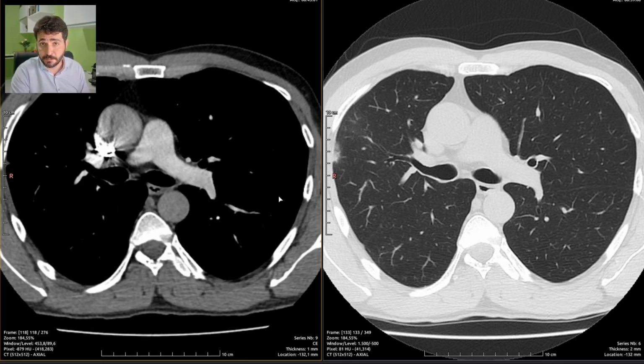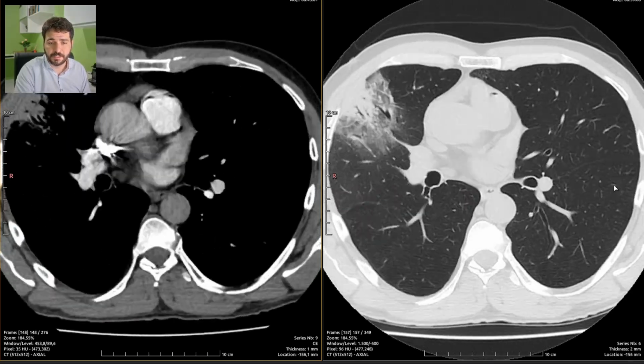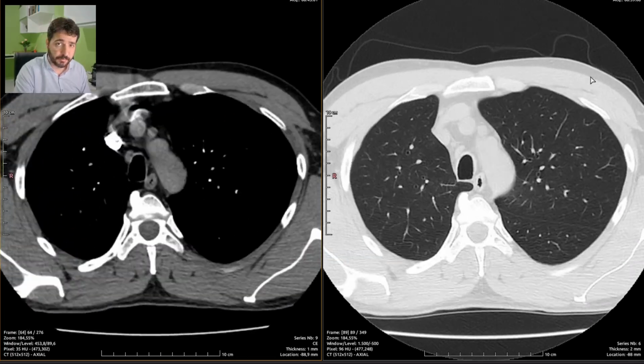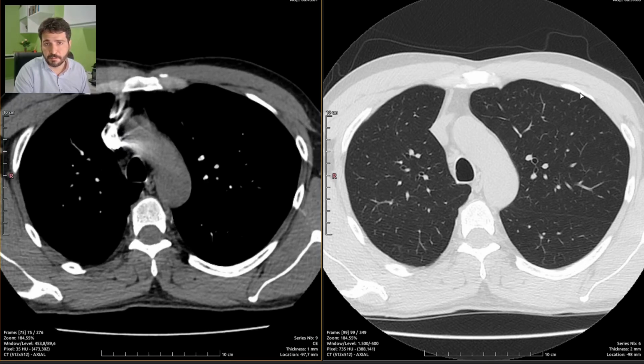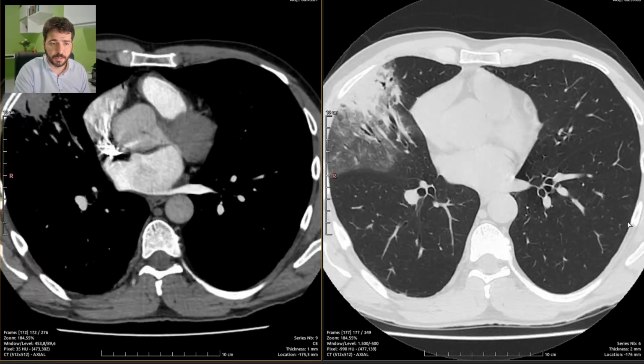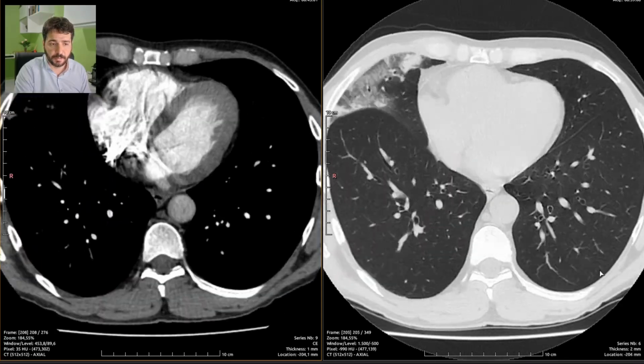And as you guys know, pulmonary arterial anatomy is quite easy to grasp because it almost follows pulmonary segmentation. So if you know pulmonary segmentation, you know arterial pulmonary branches and anatomy throughout.